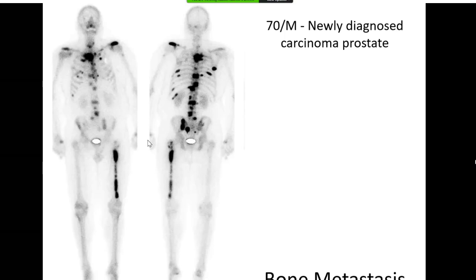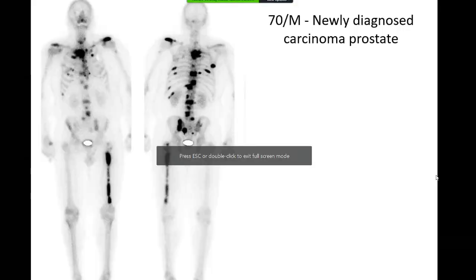So this is on the AP. Is it called as, it's a question? Yeah, sorry, go ahead with the question. I just wanted to ask whether we can say that it's a masking of the bladder. It is the masking of the bladder. It has nothing to do with protection, so it's not a radiological shield. It is just to reduce the counts from the bladder. Okay, sir. Thank you, sir. Okay, and you just basically use a small piece of any metallic material over the bladder, and that will just reduce the counts from the bladder. Thank you, sir.